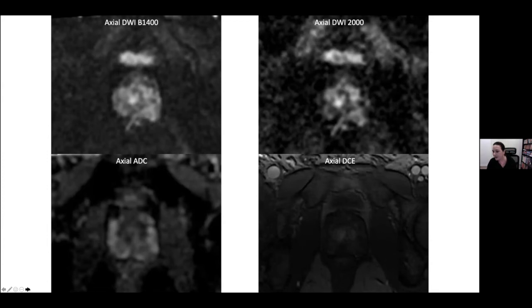Jeremy, that case where you showed the PSMA avidity of that right base, I saw that T2 lesion when you were scrolling through, and our PET MRI learning would be to go back and look at the DCE in that right central zone, because that's where we're missing the tumours on MRI that PET are finding, is in the central zone.